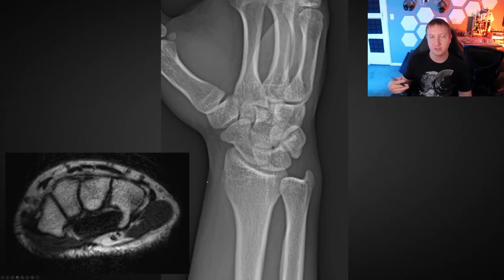And I often see people, when they first start looking at X-rays, they might think that's a fracture because it looks like cortical disruption. But as long as it's kind of continuous with the physeal scar there, we can be pretty confident that that's just normal for them.